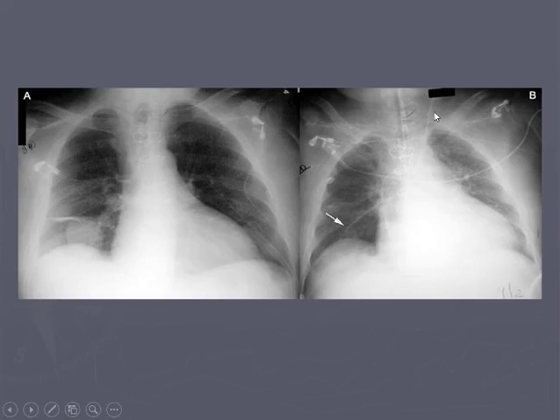I believe the story behind this one is, if you look at this one, this is a swan catheter, and it comes down, and the tip of the swan is there. And as anyone in the ICU knows, that's way too far. That's very much wedged down into the pulmonary arteries. And I'm assuming it stayed there for a while and then got this infarct here. But again, I'm not entirely sure because this is label A and this is label B. So again, it's been a number of years since I've reviewed these slides. I think that may be the story behind it, but I'm not quite sure.